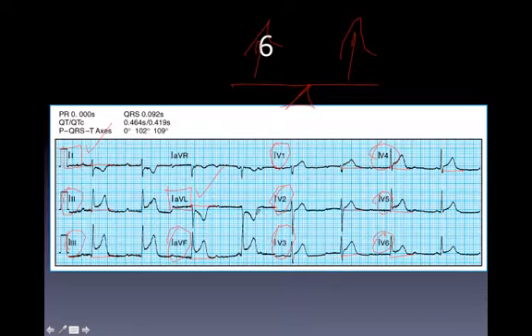This person could have triple vessel disease, or an occlusion in all 3 of the vessels, the right coronary artery, the LAD, and the circumflex. Or they could just be having the widowmaker, which is in the left main. Either one with this pattern. This is a ton of ischemia. So if you see this pattern and you're out in the field as a paramedic, if you can take another set of hands, you might be doing CPR before you get to the emergency room. This person is definitely on a time clock.